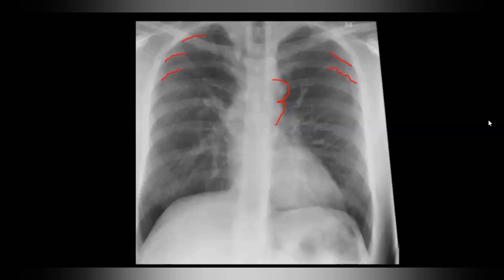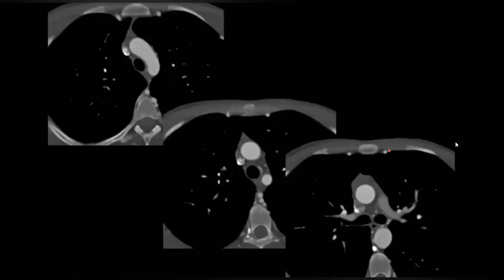Yes, sir. And in patients with SVC stenosis or occlusion with chronic diversion and engorgement of the intercostal veins, sometimes you will see rib notching. Along with that, we will appreciate a widening of the superior mediastinum. But in your practice, in the exams, inferior rib notching is coarctation of the aorta until proven otherwise.